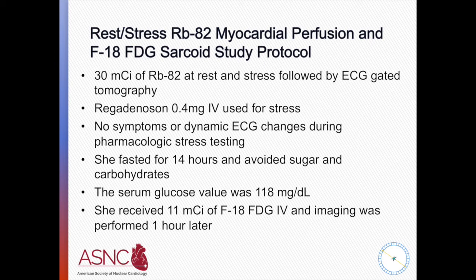So this is how the patient was prepped in preparation for the sarcoid study, and you can see that the glucose was under good control there, and FDG sarcoid images were also obtained in addition to the myocardial perfusion, as we commented already.